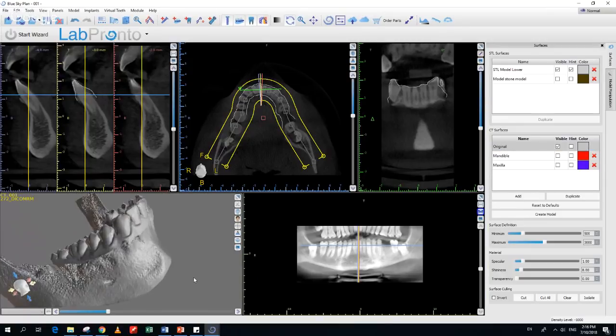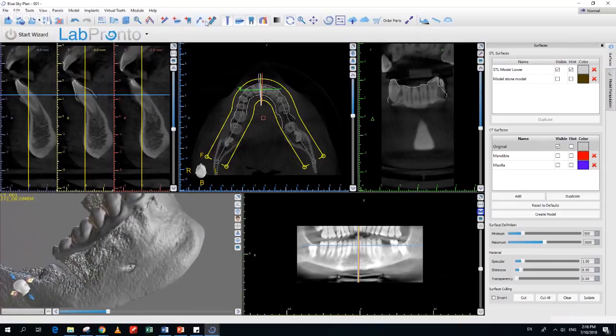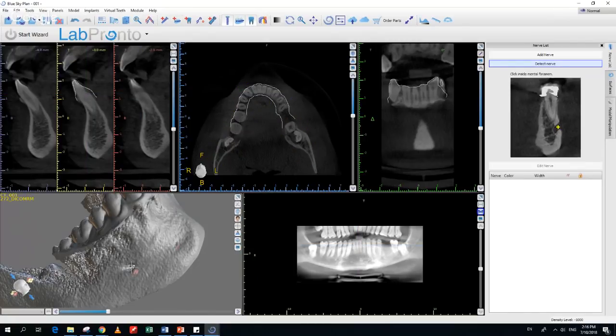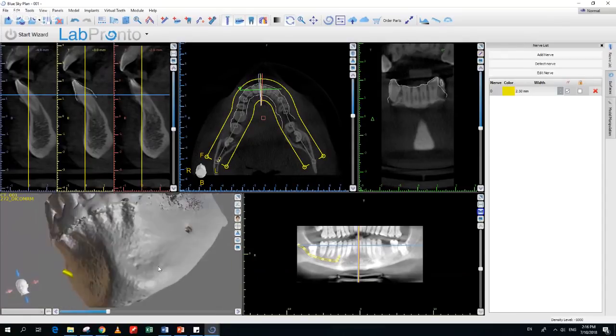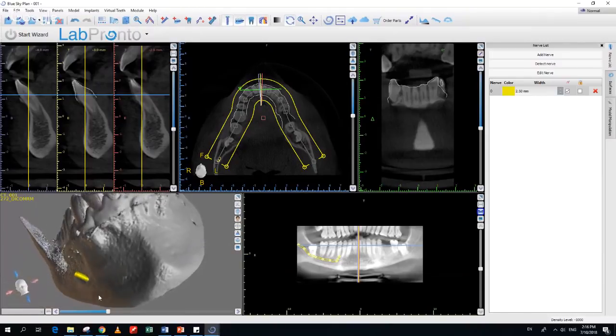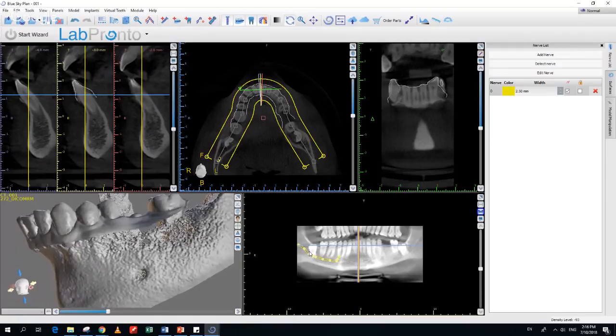Before we do that, let's mark our nerves. We could click the Add Nerve button that's up here, and the nerve panel opens. Click Detect Nerve, and we've also integrated automatic nerve detection. This isn't brand new, but if you don't know that that's there, you see I clicked once on the entrance of the nerve, and the software has marked the nerve for me.